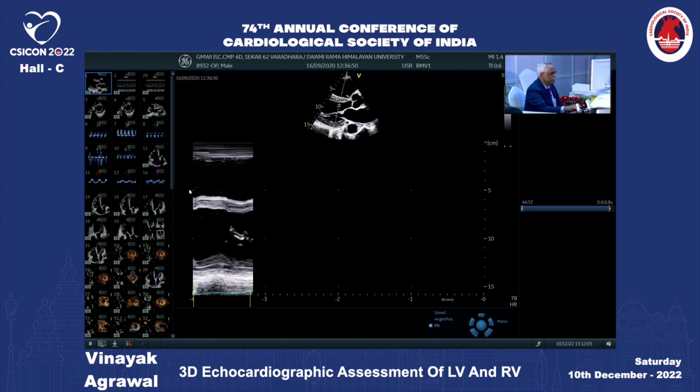Here we can measure the diastolic diameter, from the inside of the interventricular septum to the inside of the left ventricular posterior wall. From that, usually we use the cube formula for getting the volume. Similarly, during systole, we can get the diameter and apply the cube formula. So from that, we used to calculate the stroke volume and then the ejection fraction. That is one of the oldest methods which we have been using.